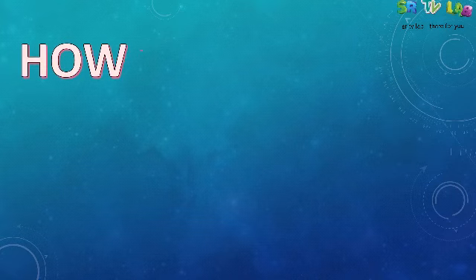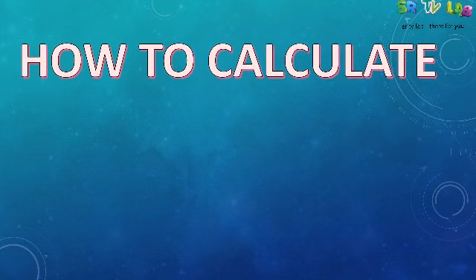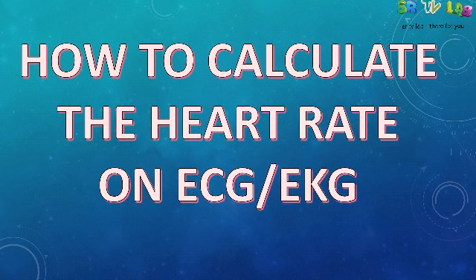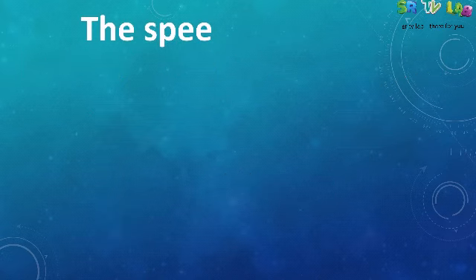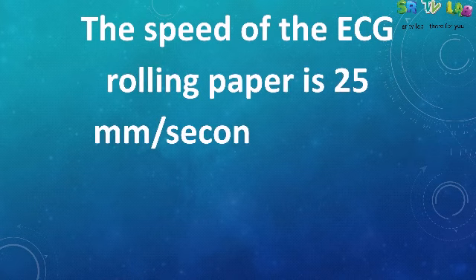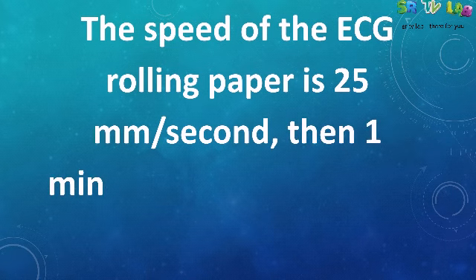So ladies and gentlemen, let us see how to calculate the heart rate just on ECG or EKG. Actually, it's very easy to calculate the heart rate. You use the speed of the ECG paper within the machine, which is 25 millimeter per second.